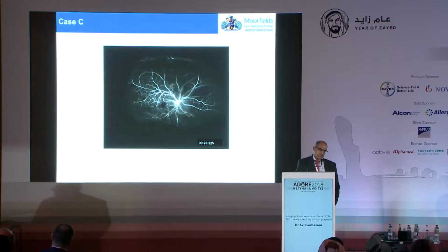Large areas of occlusion seen in this patient, where you can see that there's been occlusive vascular disease, and you can see these in vein occlusions. So this is a patient who had a vein occlusion secondary to lupus, and ended up with the angiogram showing the non-perfusion in the far periphery. So things that we would not have picked up earlier on conventional angiogram.